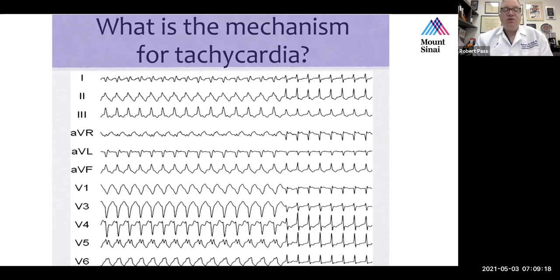One of the reasons we don't ablate small children is because we're always nervous that the pathway is going to end up being right next to the node. But in this particular case, we see pretty clearly that the pathway is quite remote from the node because it's a left-sided pathway. And so I certainly have had this circumstance where I've seen this in an infant, and I've recorded it in my notes so that I remember in the future, particularly if the patient is not pre-excited, because there would be no other way to know whether the pathway is right or left-sided.